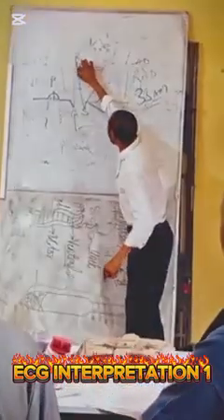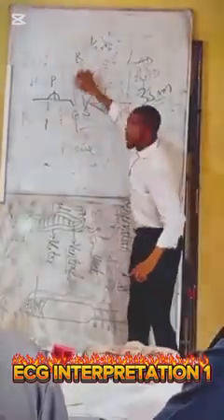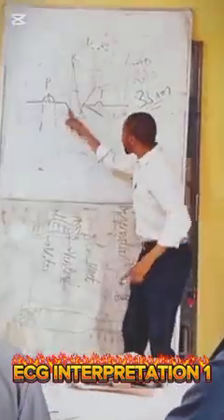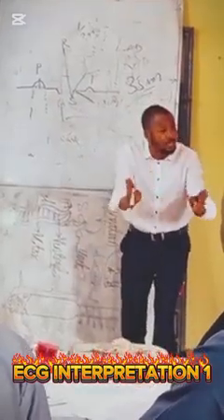So if you divide it, you carry one part from here, you put it here, it will be the same. Then when this Q wave is now greater than one part of it, you know the Q wave is going what? Pathological what? Q wave. This is what is called standing out in terms of fundamental physiology.